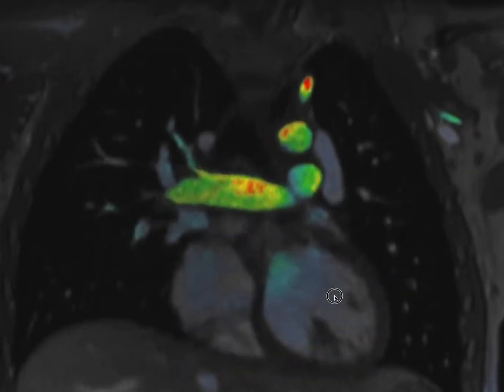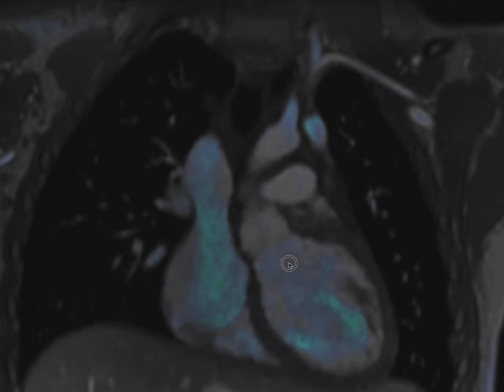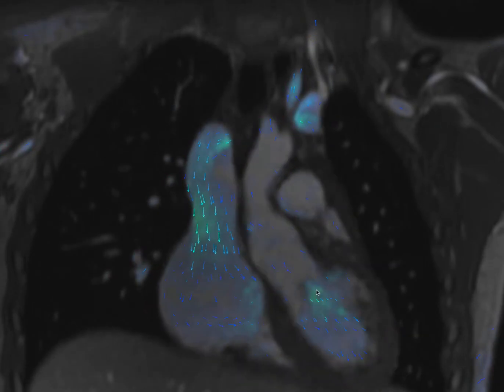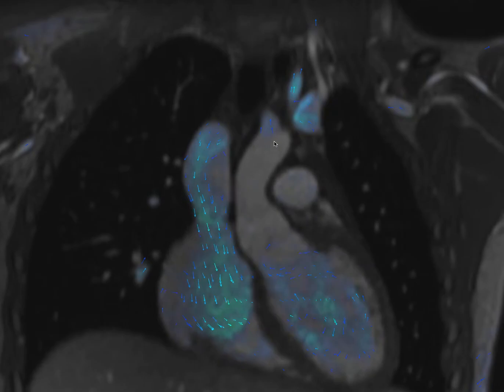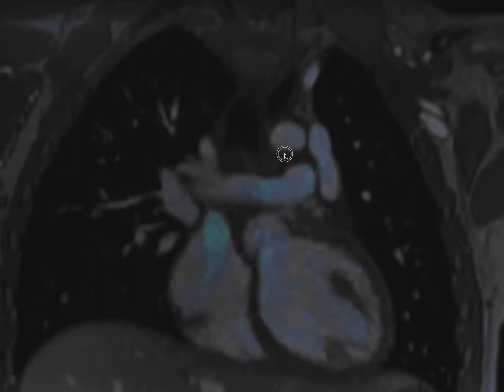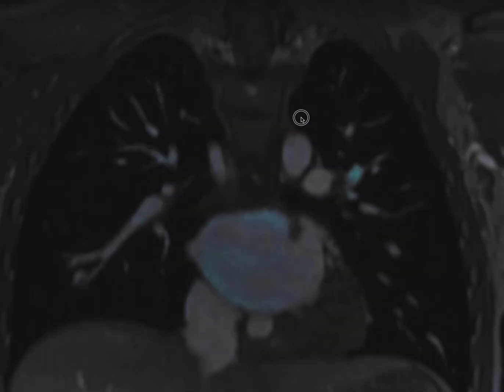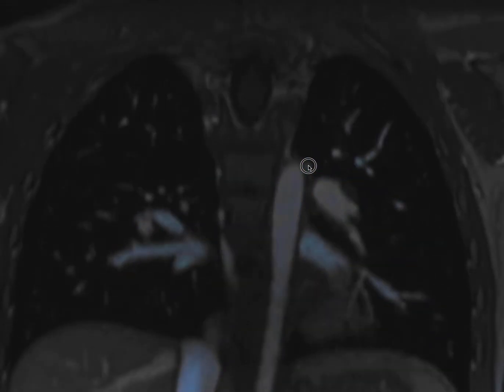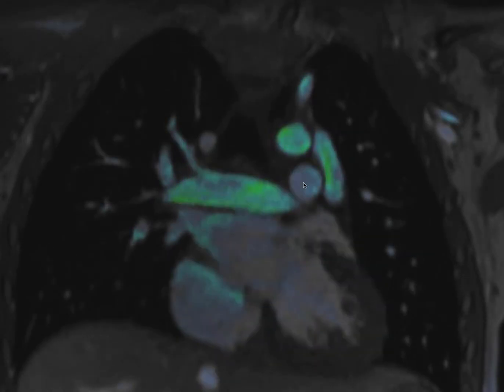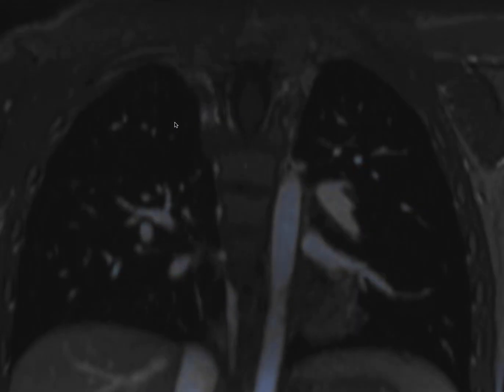ventricle. And then from the left ventricle, we will see the blood heading through the aortic valve. So here's the aorta, and then we'll see the blood flowing out again. Here you can see it flowing out the aorta through the arch, and then those 3 arch vessels that I mentioned before. Here's that left subclavian as the last of the 3 arch vessels, and then the descending aorta heading inferiorly. So that's the cardiac anatomy shown through an MRI in 2 planes.